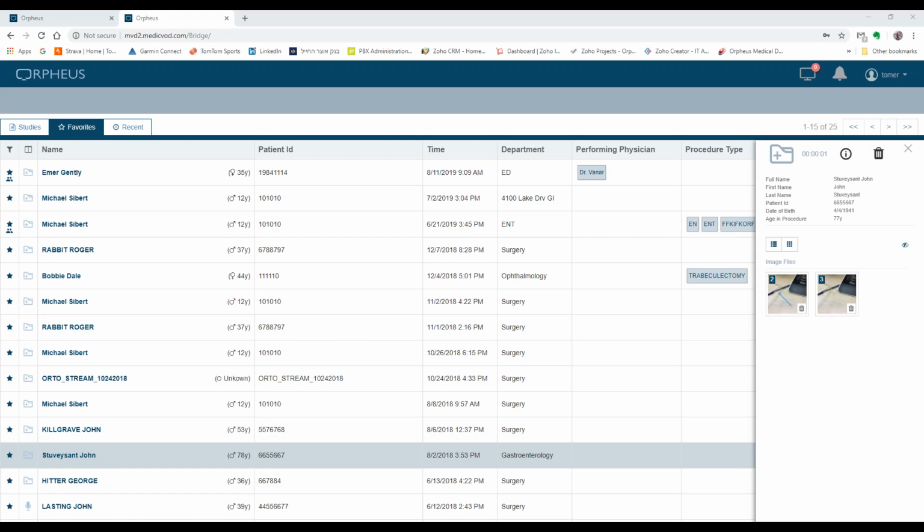Or when I was there a couple of weeks ago, I saw, I think it was Dr. Gomez, if I'm not mistaken, showing some kind of homegrown USB thumb drive HDMI recorder that they would connect to the Fujinon system. So why not utilize Orpheus Web as that centralized platform for videos wherever you can? And that's the purpose of today.